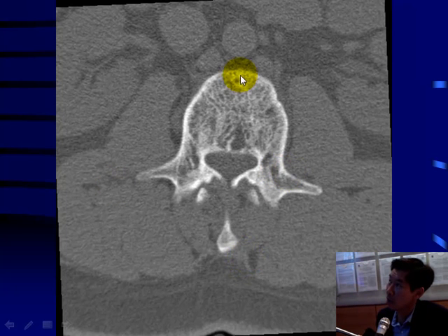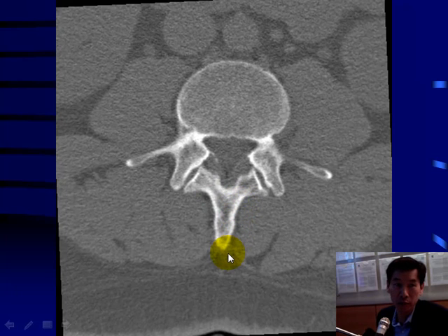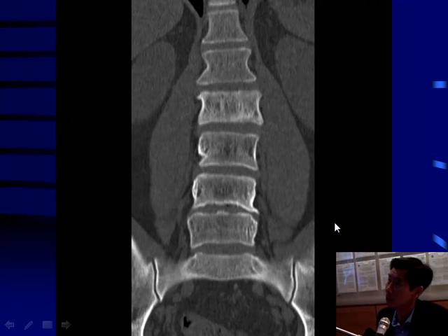And in the vertebra, same thing. We have a trabecular thickening. It might, at first glance, mimic a hemangioma, but it's different from hemangioma, right? Further down, notice this expansion of the spinous process. Even though it is expanded, the cortex is not lost. It's not destroyed. Okay? Expansion of the bone, but yet the cortex is not destroyed. Pretty unusual. This is Paget's disease.